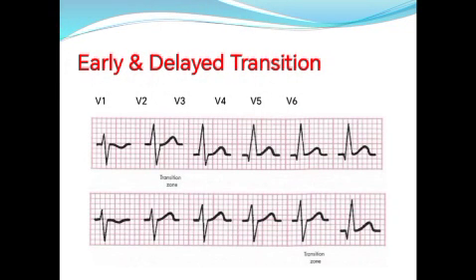Early or delayed transition zone. What does transition zone mean? It is where the R wave and the S wave are equal.